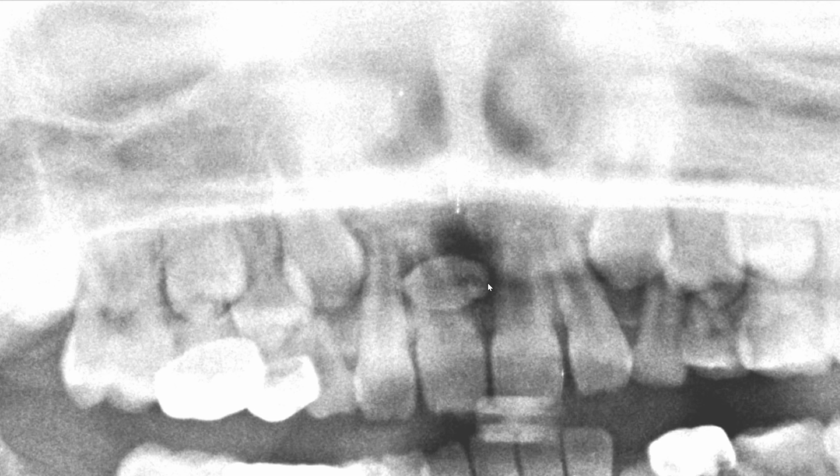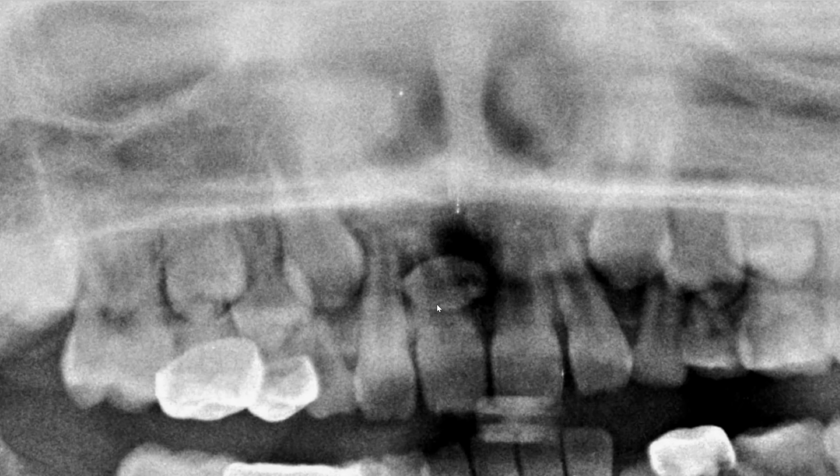Only because we've now seen periapical radiograph, you can maybe say that this is the enamel layer. It certainly is a little bit more radiopaque, but without having seen the other radiograph, it would have been much more challenging to say this is enamel. And we are seeing the pulpal chamber or the pulpal canal space.